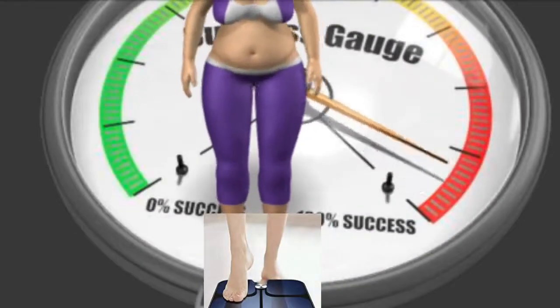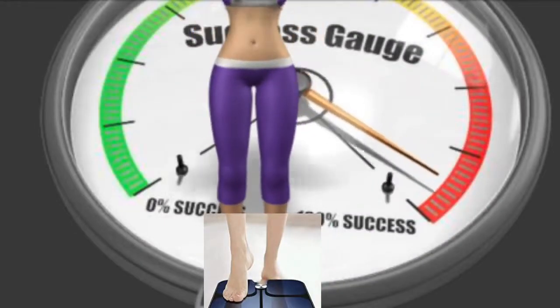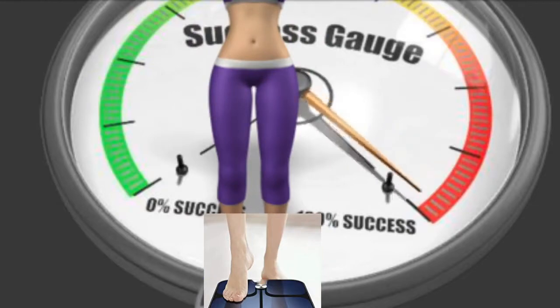The monitoring rule will allow you to monitor excess weight gain or loss from the last measurement received from the patient.